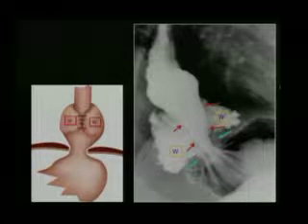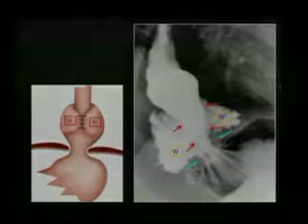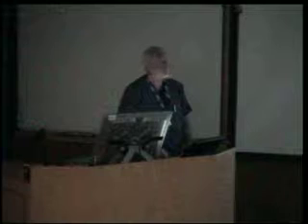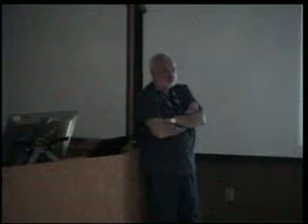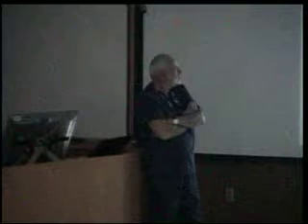Yeah, that's what they put in loops. The problem I see in all these films is that the wrap is not in the way it should be. These are low wraps. The idea of the wrap is to put it in the lower esophagus, not in the stomach, and that is because of lack of dissection. So the wrap accomplishes a pressure mechanism that mimics a sphincter, an external sphincter. That is what will happen, and the patient has pain and all things because of this.